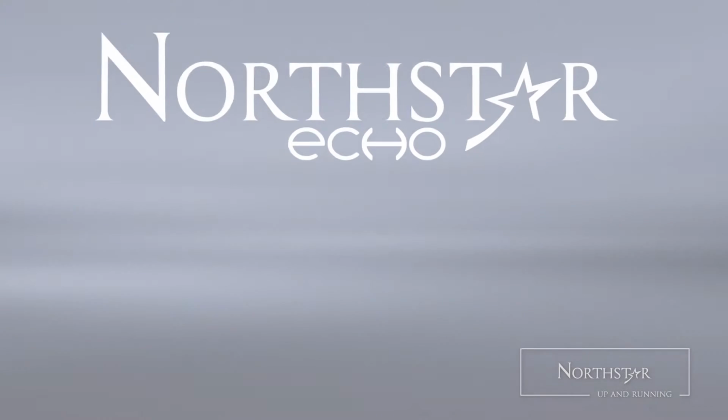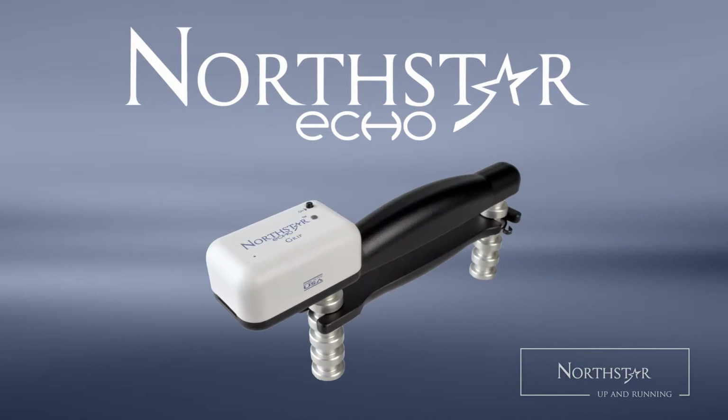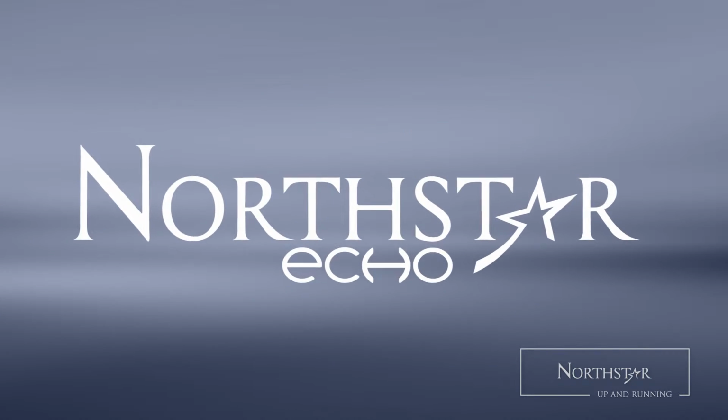Objective physical assessment is a huge component of Northstar, and there's much more to the test section than we can thoroughly cover in this video, but we'll give you a broad overview of testing, then go more in-depth in a future tutorial video. Northstar has been built to work seamlessly with our Northstar Echo wireless evaluation product, but you can also enter data manually in almost any testing screen in the software.